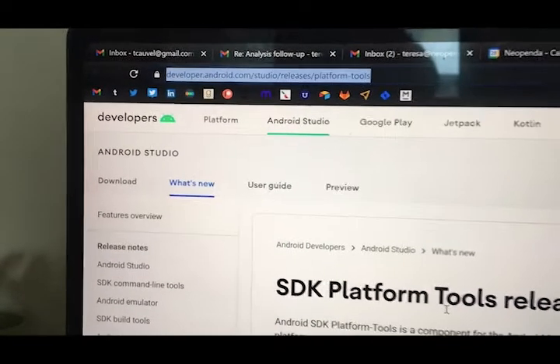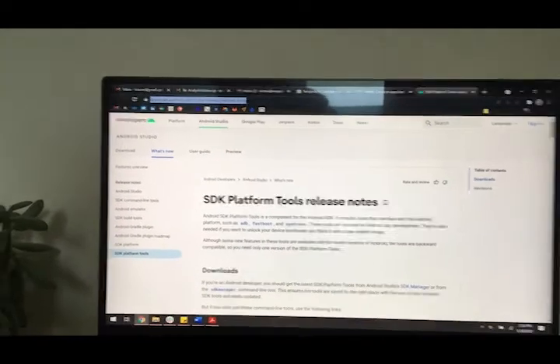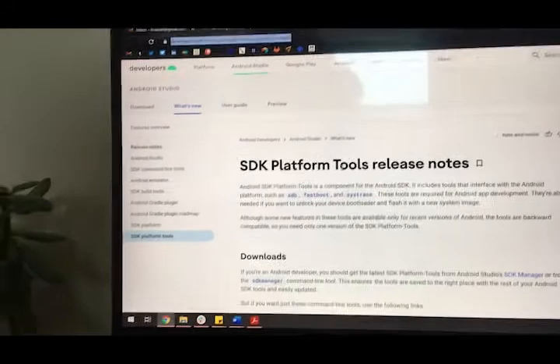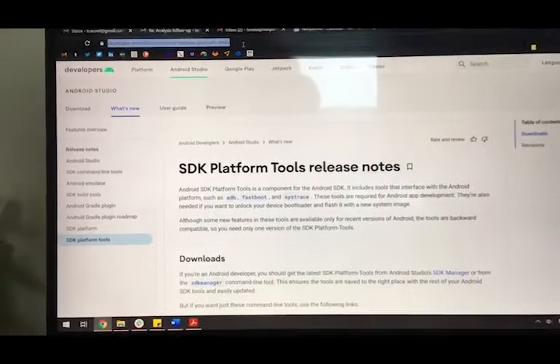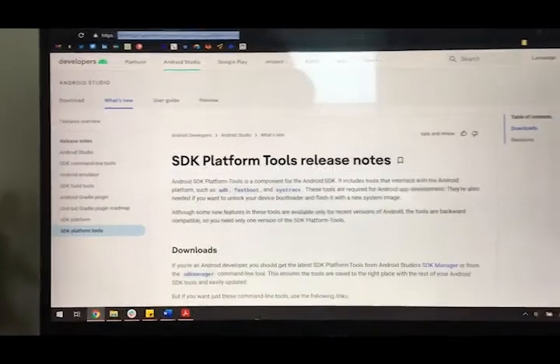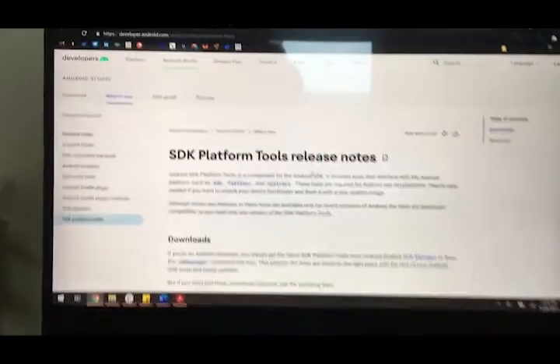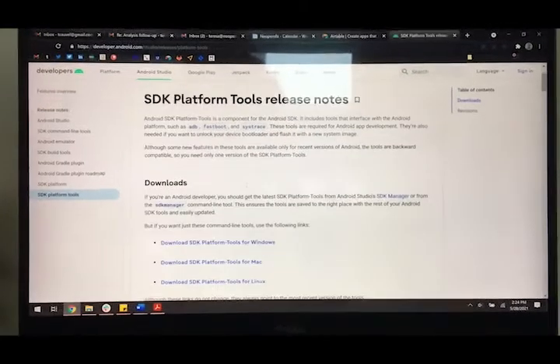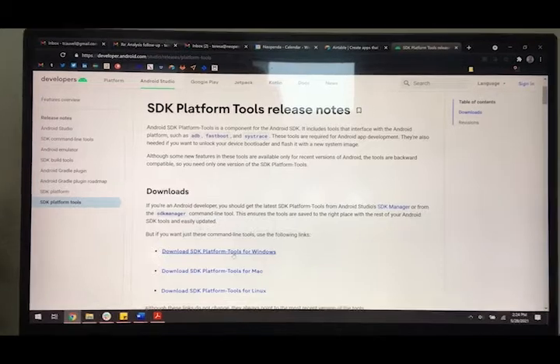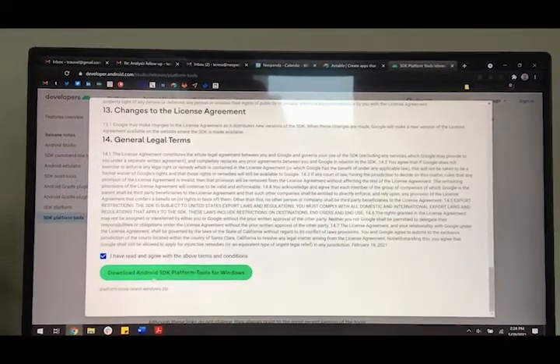Okay, for part 2, we are going to start on our PC and do the setup here that we need before we can install the new program on the tablet. So if this is not already installed, the Android Developer Toolkit, we'll have to download it from the link provided. So I'm here on the site. I'm going to download the Windows version of the Android SDK platform tools by selecting this link and accepting the agreement.